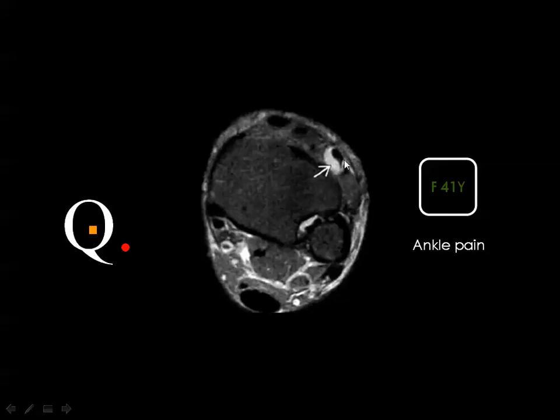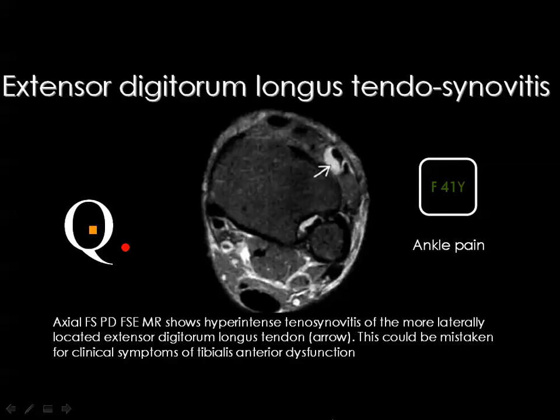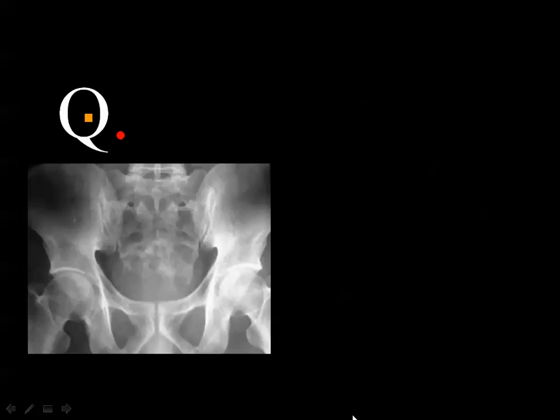Fluid signal around this is extensor digitorum, extensor hallucis, tibialis anterior, and this is extensor digitorum tenosynovitis.